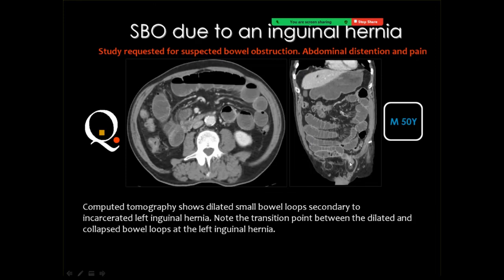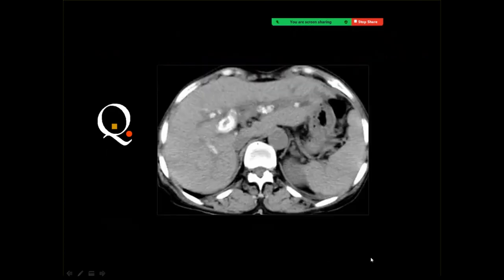There is extension of the bowel into the inguinal canal, and at that time you should consider this hernia as incarcerated hernia, because if it is not associated with intestinal obstruction, you consider it simple hernia. But if the hernia is associated with obstructive changes, that's to say that it is incarcerated, meaning that it is not reducible. So it has resulted in this obstructive changes.